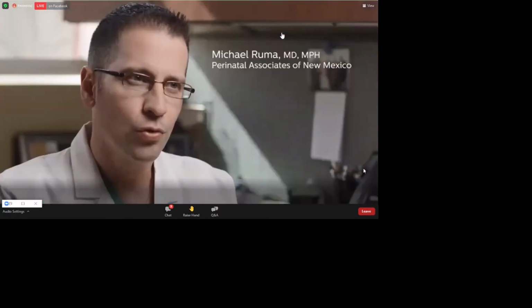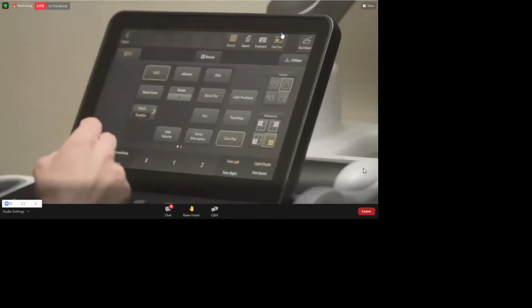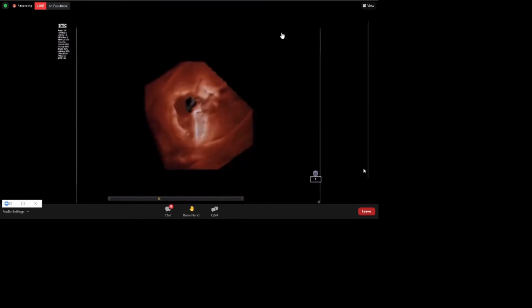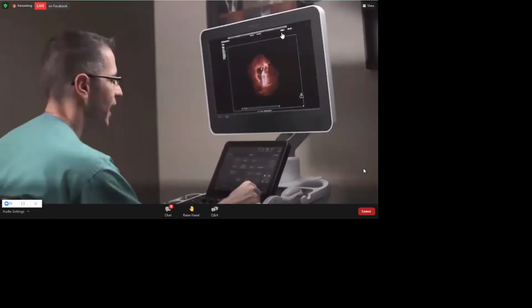TrueView is quite remarkable. You really get a true sense of what it would look like in absolute photorealistic fashion. The colorings, the shading, the tones are truly realistic. When we move to TrueView imaging, we have this pink hue that alone is simply coloring. But as you can see, what I've done here is I've brought the light actually within the left ventricle using the depth capacity, which is unique to TrueView, and allows the light to enter along a Z-axis.